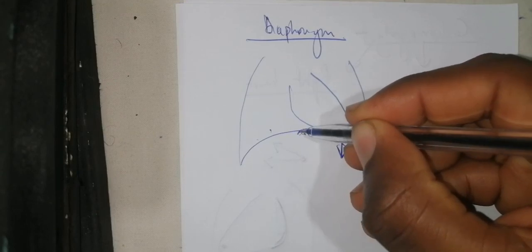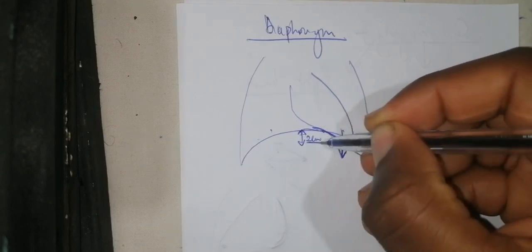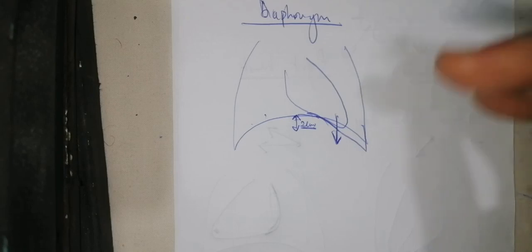In the case where the right becomes lower than the left, it's a case of Kartagener syndrome, and that one is going to be associated with a dextrocardia. Normally the distance separating the left and the right should be 2 centimeters at least. Particularly for the diaphragm, there is Kartagener syndrome, or if you have a pleural effusion, that may change the level at which you see the diaphragm.